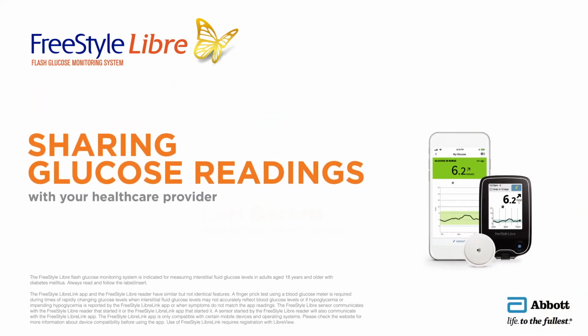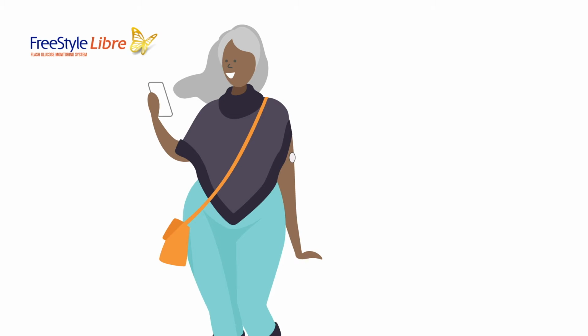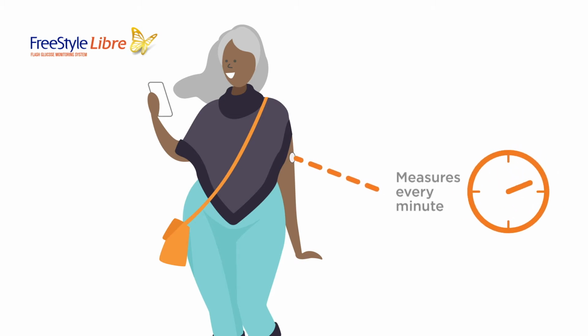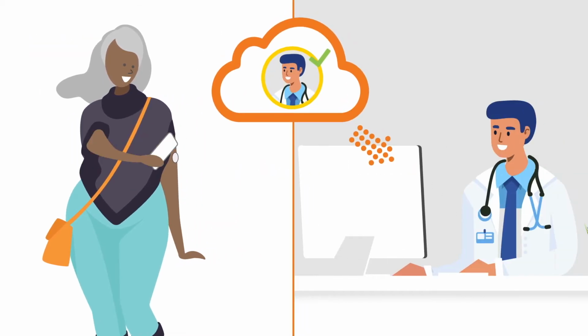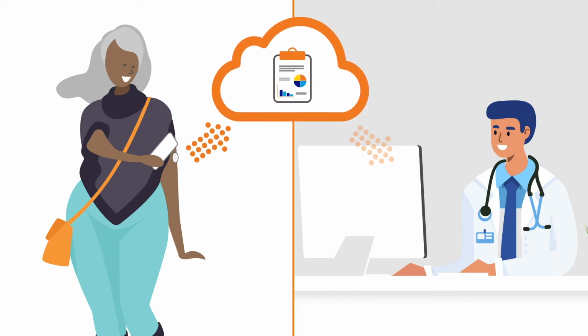In this video, we're going to show you how to connect to your healthcare provider so you can begin sharing your glucose readings. Did you know the FreeStyle Libre system measures your glucose every minute? These readings provide you and your healthcare provider with valuable information. In fact, sharing glucose readings with your healthcare provider allows for easier and more productive conversations about your diabetes management.